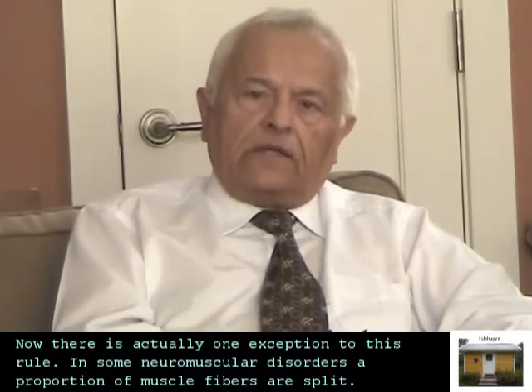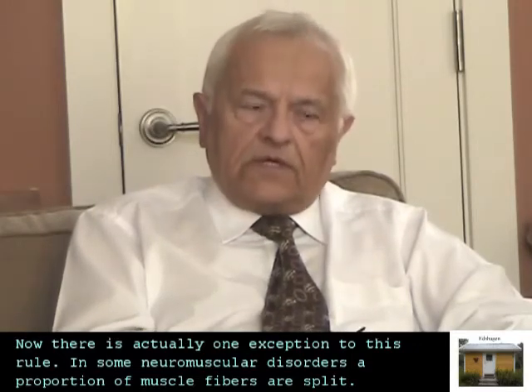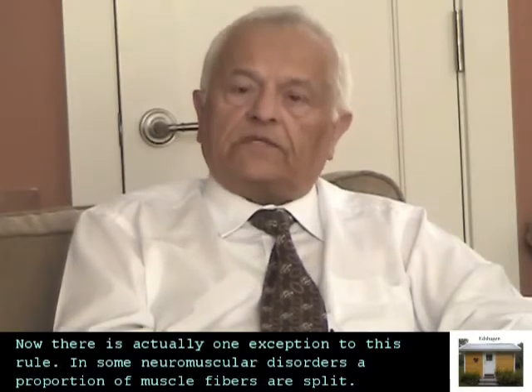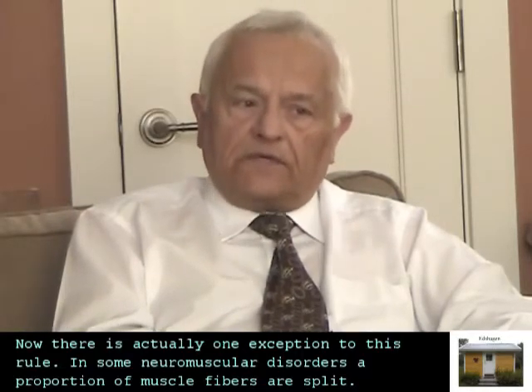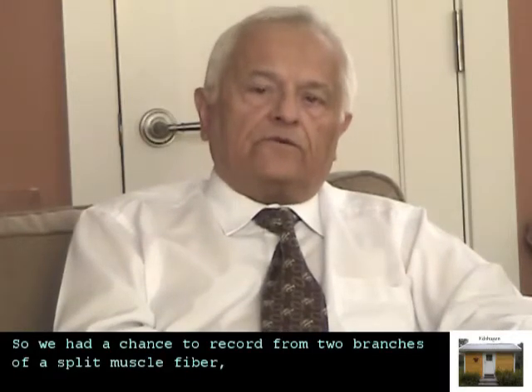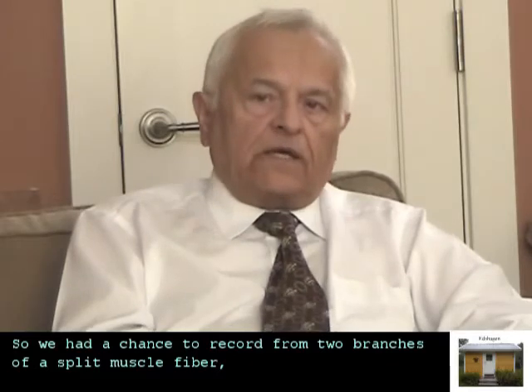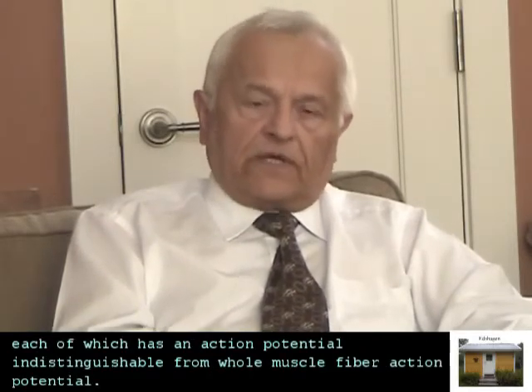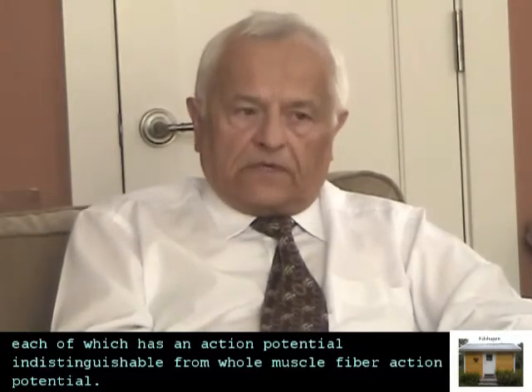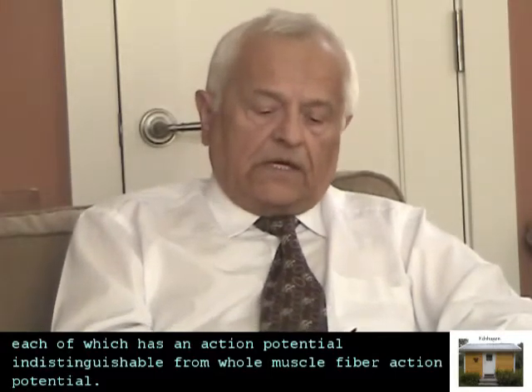In some neuromuscular disorders, a proportion of muscle fibers are split, sometimes really a great proportion. So we have a chance to record from 2 branches of a split muscle fiber, each of which has an action potential indistinguishable from a whole muscle fiber action potential.